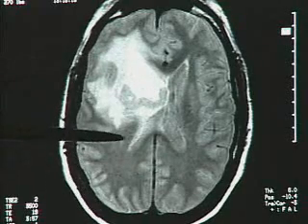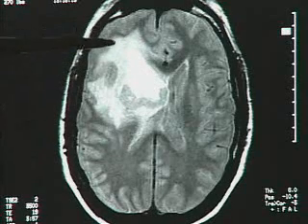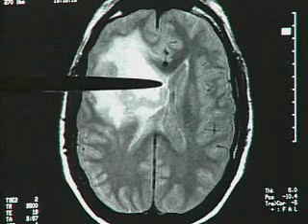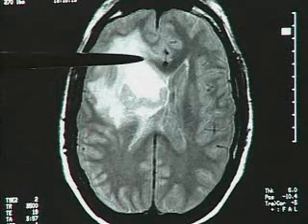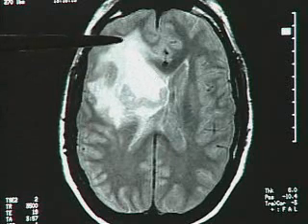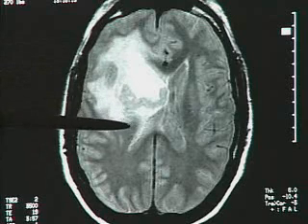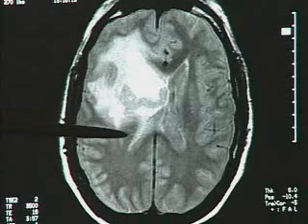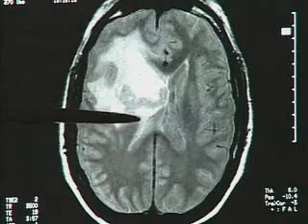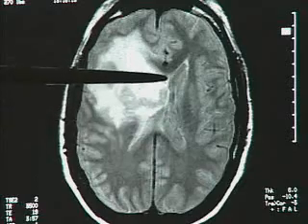What we see here is a tumor in the right hemisphere pressing the right lateral ventricle. The main part of the tumor is where this slightly increased whiteness is, and then surrounding the tumor is the edema. What we see here, the right hemisphere is pushed over to the left hemisphere. We see the right lateral ventricle being compressed by the tumor.